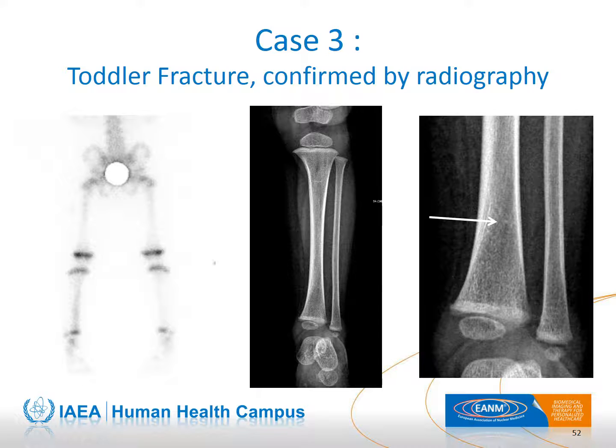No. The first hypothesis is toddler fracture, and this is confirmed by plain radiography oriented by scintigraphy, showing a clear line on the tibial diaphysis.